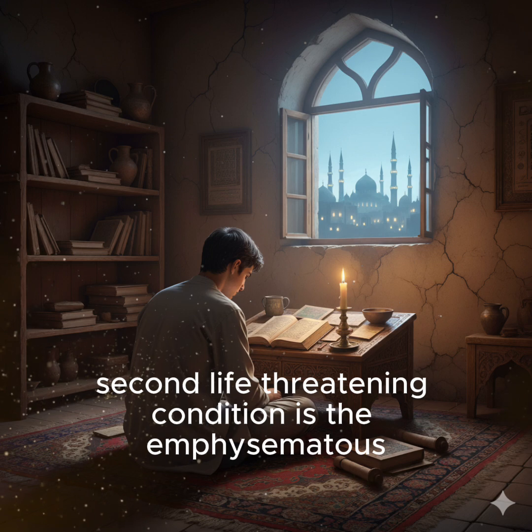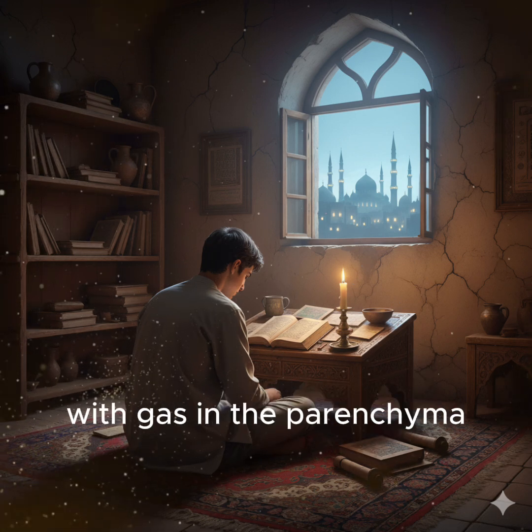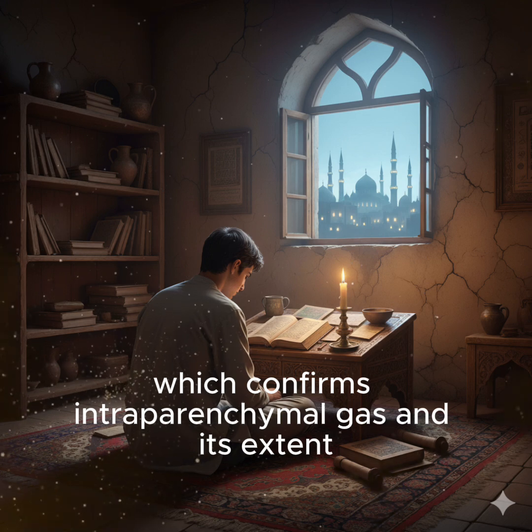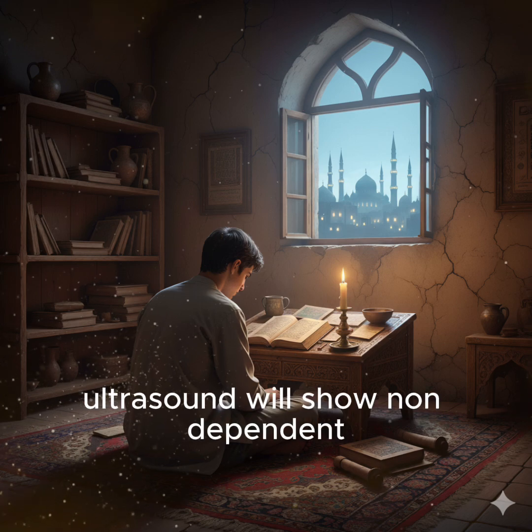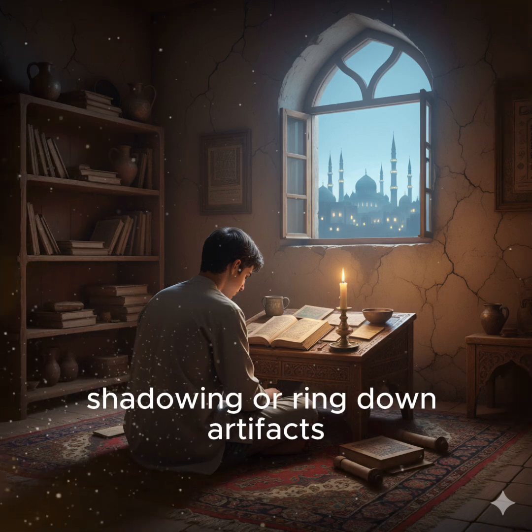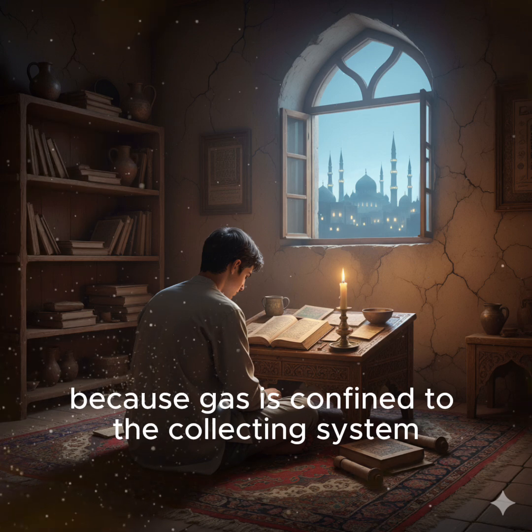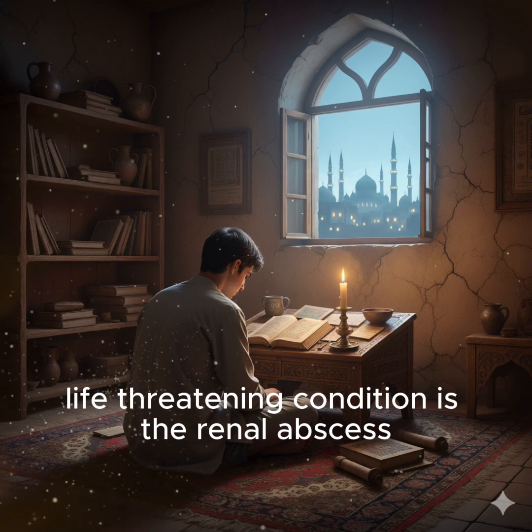Second life-threatening condition is emphysematous pyelonephritis, which is a necrotizing infection with gas in the parenchyma, often seen in diabetic patients. CECT is the main modality here, which confirms intraparenchymal gas and its extent. Look also for associated fluid collections and perirenal extension. Ultrasound will show non-dependent echogenic foci with characteristic dirty shadowing or ring-down artifacts. The differential here is emphysematous pyelitis, which is less severe because gas is confined to the collecting system, meaning only pelvis and calyces.